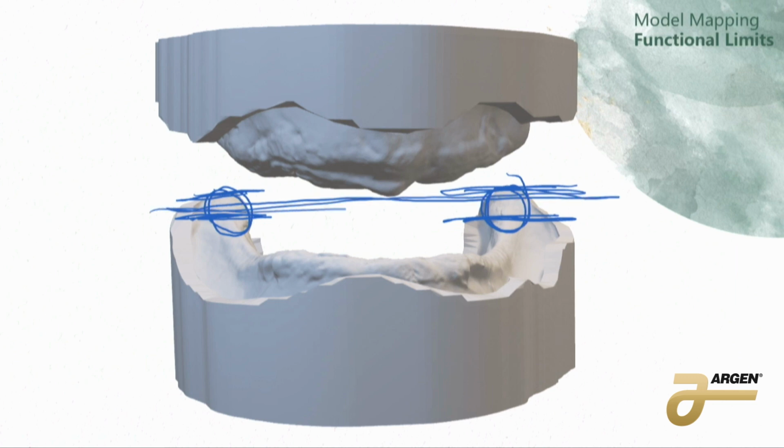So what is our limit there? How high or low can we set those teeth? Again, we're going to find our retromolar pads, and this is going to be our guide. We have some leeway, so somewhere between 1/2 to 2/3 is typically where you want it to be. Somewhere between here and here. I'm going to go over this in 3Shape as an example, and we can have that anywhere here. So that's how we would find posteriorly, right?